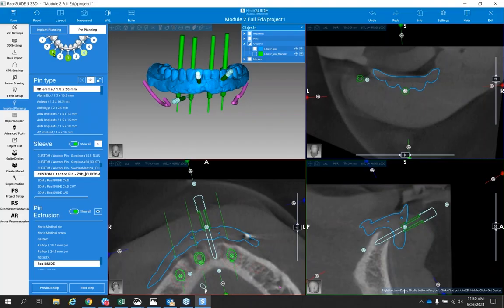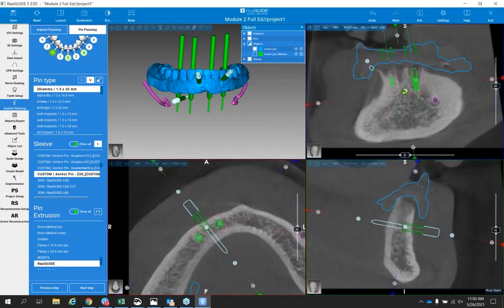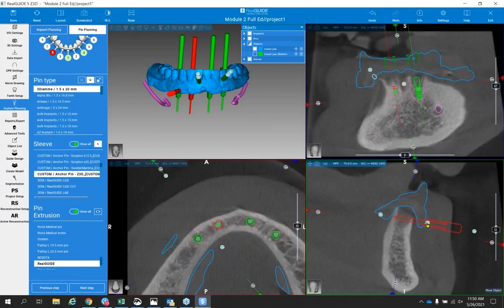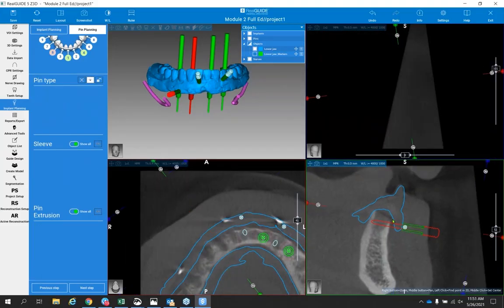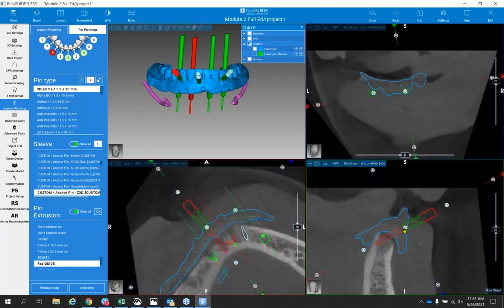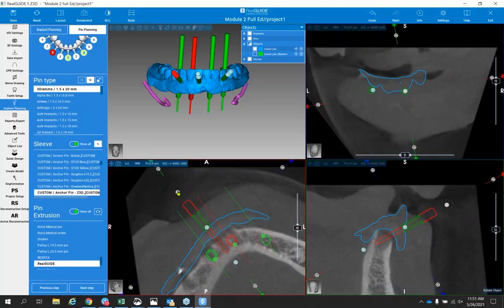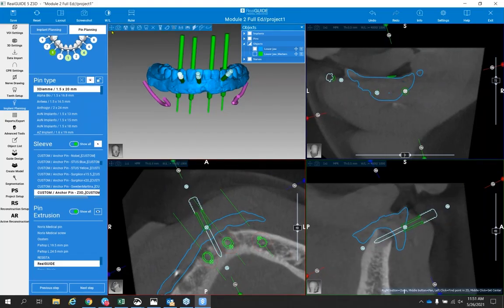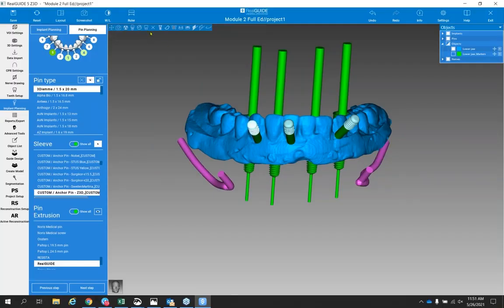I want to choose on this pin, sorry. Okay, this might be a little tighter. We're going to get it out. Got my closing, not worried about that. Get it up. But I want to show you what's really nice is I can see the patient's face when I'm setting these pins. Now I'm getting collision because my pin is probably in my safety zones around the implants. All right, so this pin actually might need to go in a different location, maybe behind the implant at 28. All right, but we'll leave it here for now. Oh, turned to green.